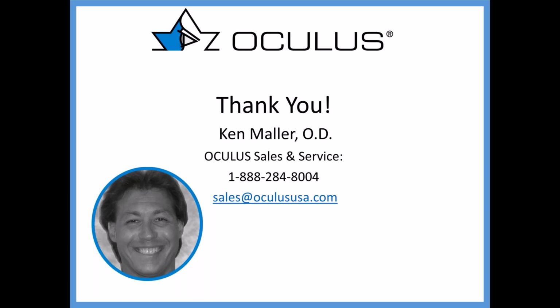My feeling on that first lens is more than likely there's going to be something that I'm going to have to fine tune, whether it's something about an edge profile, maybe the apical clearance isn't just enough or just the way I like it, or the limbal clearance isn't enough in one area or something like that. And then I use that really as my trial lens so that I can get the proper optics onto that lens for the second lens. Almost always I'm done by the second lens though.